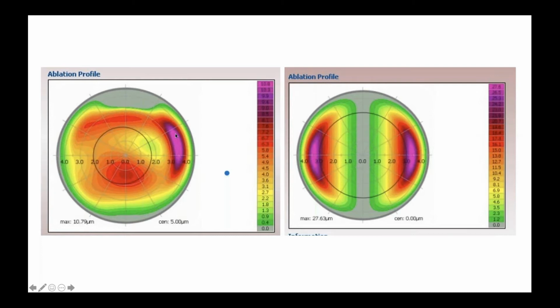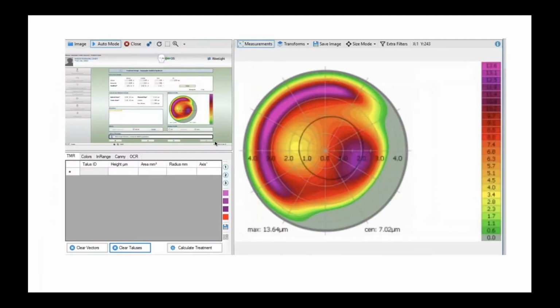On the left is a patient's actual topographic map, and this particular talus is what I would say is standard or average in size. This is what we're after in terms of our standard. So why do we even have to think about this? Because sometimes these taluses are quite irregular. They're very strangely shaped, and so the software here is going to say there's two taluses. And technically the software is right.